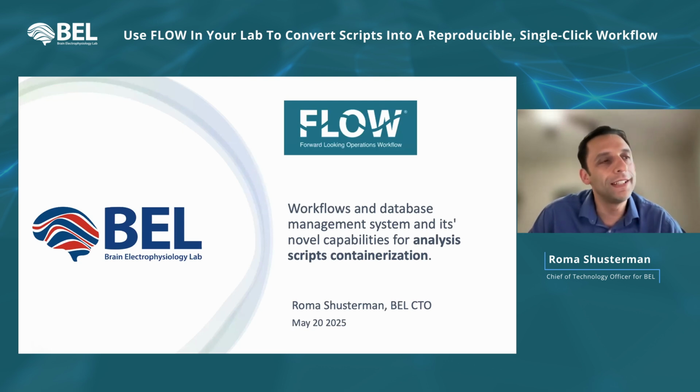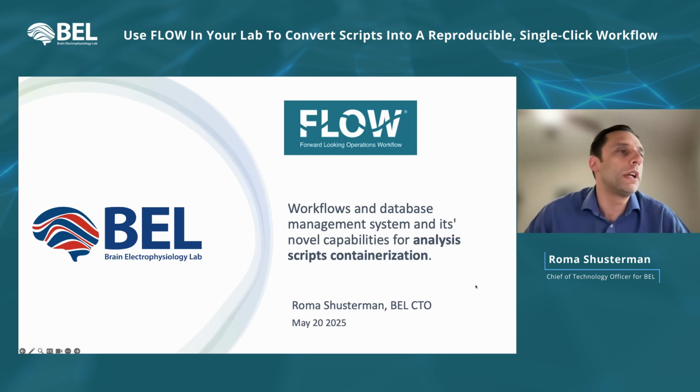And finally, I'm very excited to introduce this feature that we worked on last year, which allows researchers to containerize their developed analysis, and within a few minutes bring their analysis from just a running notebook or Python and MATLAB into a one-click solution.